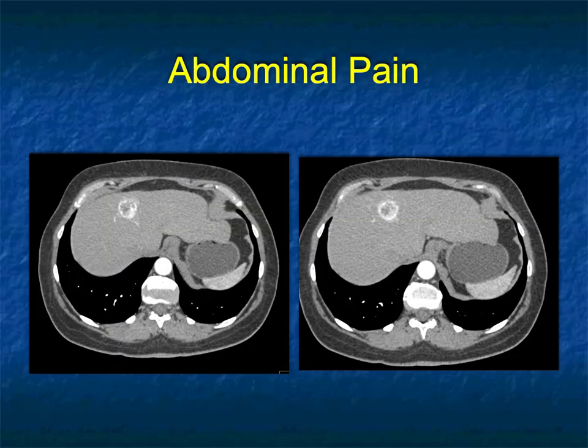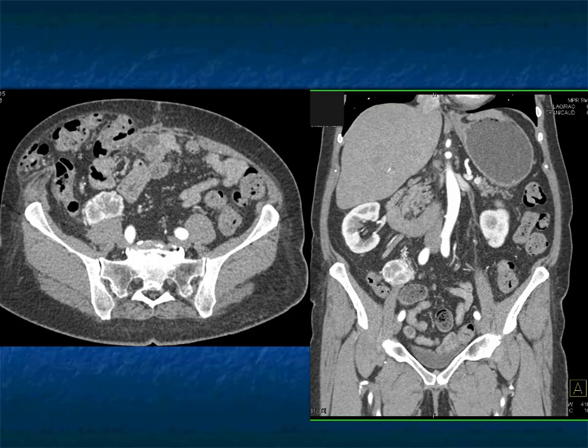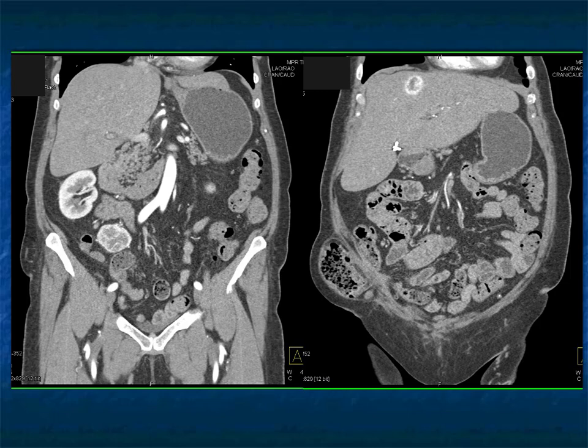What about this case? A vascular lesion in the liver and then a vascular mass in the right lower quadrant. Quickly, the fast thing to think of is a carcinoid tumor with mets to the liver. And that's a possibility, but this is not in the bowel. It's outside the bowel, kind of sitting on the psoas muscle directly. So what are you thinking about? Now, we talk about Castleman's disease being vascular, but Castleman's is benign, so it would not explain the liver, and the liver is worrisome.